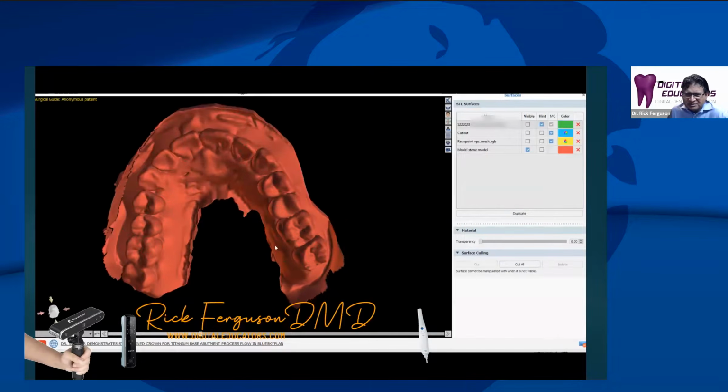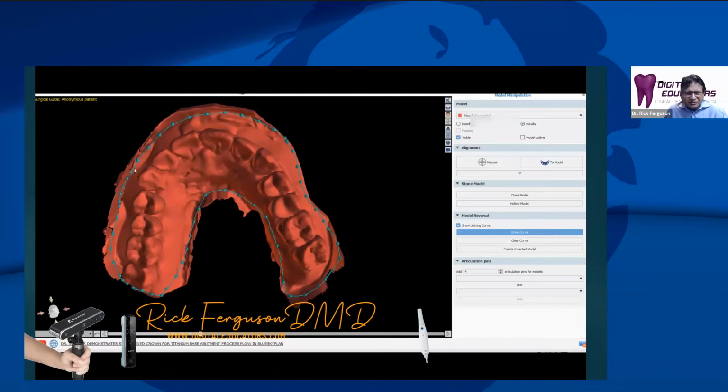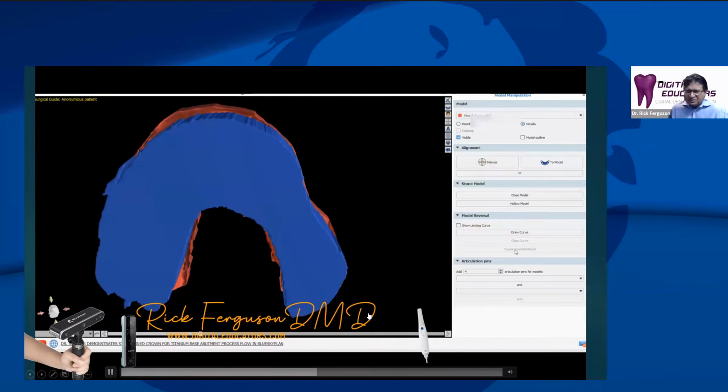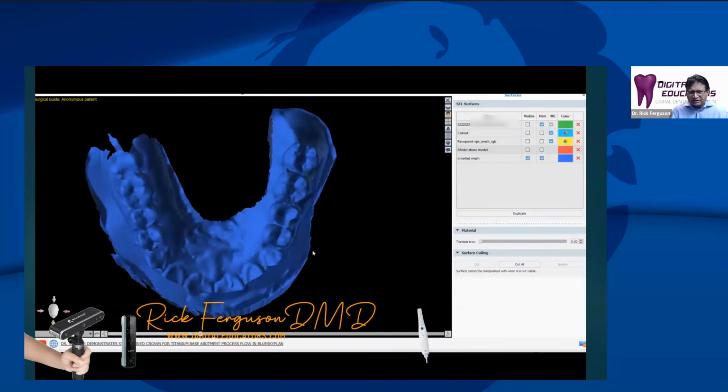Basically, we can do that. Clean this model up as well. And you'll see, Blue Sky arbitrarily chooses a color. So I'll go back and make this white in a second here. And then we can see this image through the cutout.